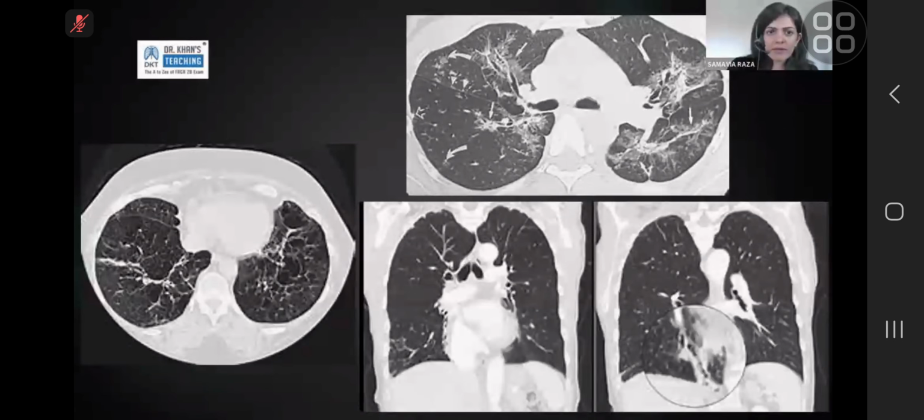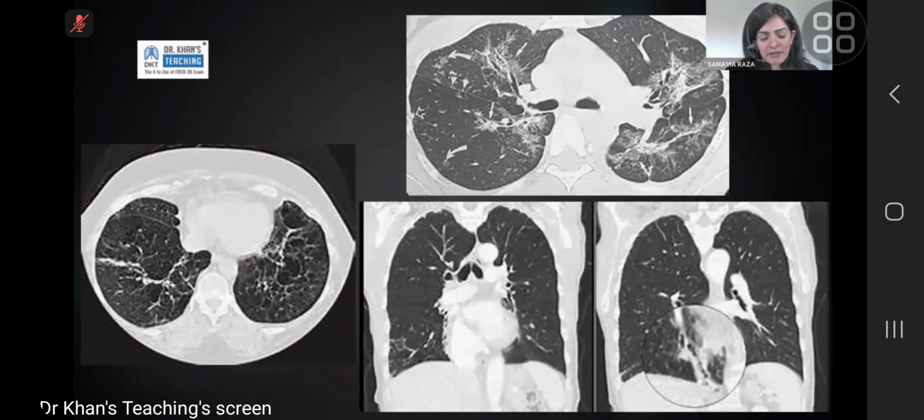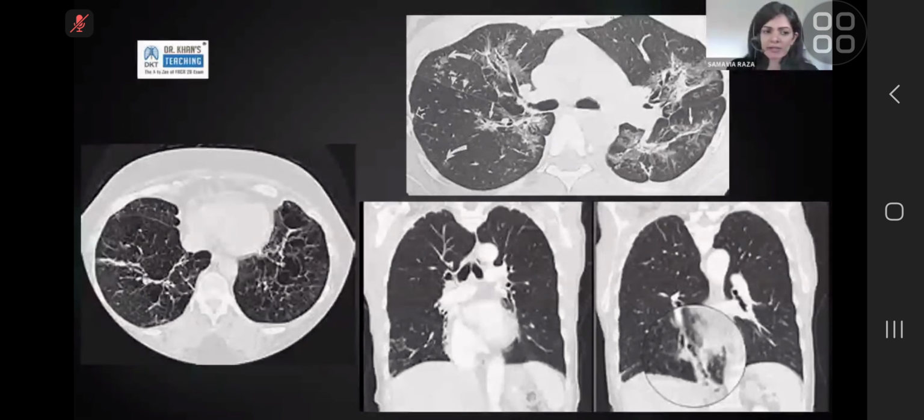Okay. These are different patients, and I put them just to give you an idea of what you want to look for when you're thinking of chronic versus acute or old versus new. On this one, very linear change, very clear linear atelectasis. So yes, old. Anything sinister looking about it? Anything particularly requiring follow-up? No. So this is, I would dismiss it in a heartbeat.